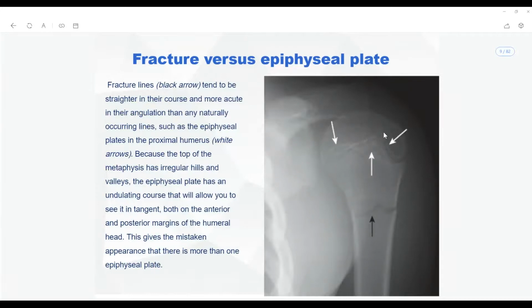So this is continuous like this. Do you understand? This is continuous like this. So if it is continuous like this, I can understand that I am indeed looking at the epiphyseal line, and these white hyperlucent lines that I see here are the epiphyseal plates. Okay, is this clear, Benedict? All the other guys, is this clear?